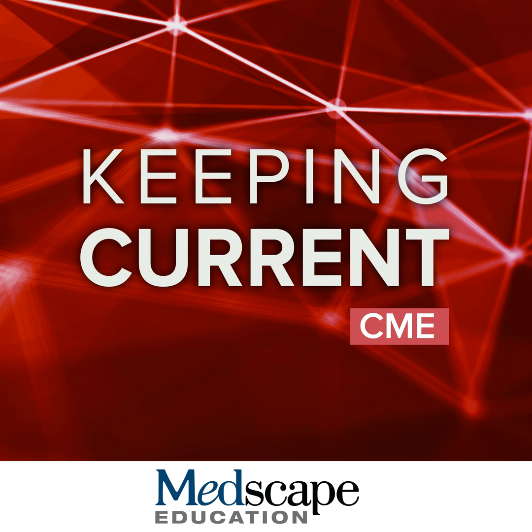And then for delayed enhancement, what happens is the contrast, when it is injected and when it encounters an area of scarring, there is a breakdown in the blood tissue barrier. The gadolinium contrast is retained. Gadolinium is a T1 shortening agent. And when you image the heart with a T1 weighted technique, which is what our delayed enhanced imaging technique is, you get bright signal. And this is shown here by the bright signal retained in an area of subendocardial infarction in the inferior and infralateral wall of the heart.